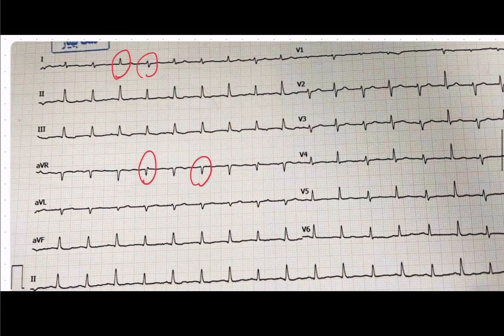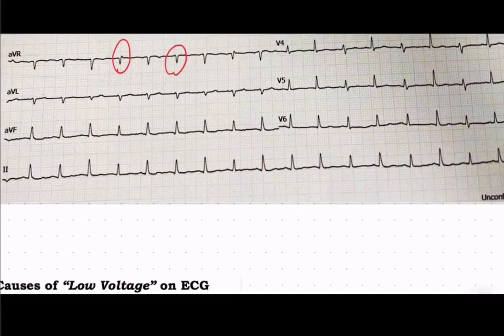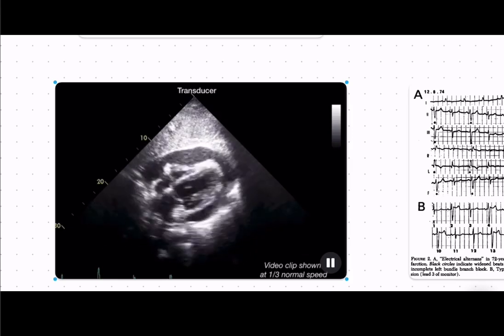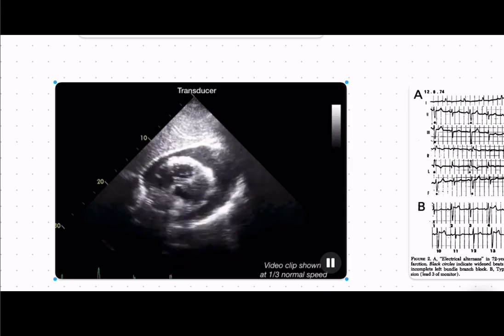Back to ECG. The second most prominent finding in this ECG is electrical alternans. You can see, for example, in V2, consecutive normally conducted QRSs that alternate in height. A typical cause of electrical alternans is pericardial effusion and is due to periodic wobbling of the heart in the pericardium. In cases of severe pericardial effusion, the heart in certain beats is near the chest, and in others it is more distant, causing electrical alternans.